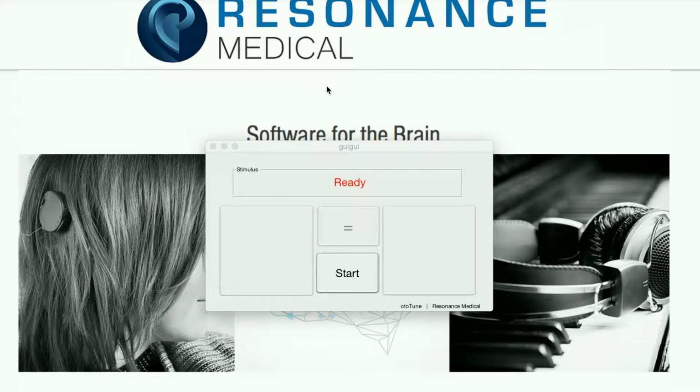And so we can put a distribution over our best estimate as well. And as the algorithm proceeds, this distribution will get tighter, and we're actually drawing our parameters to present to the user from this distribution. And so after a sufficiently large number of trials, this converges on a specific area of the parameter space, and both of these options will sound similar but both good. And so let's just see how this works.